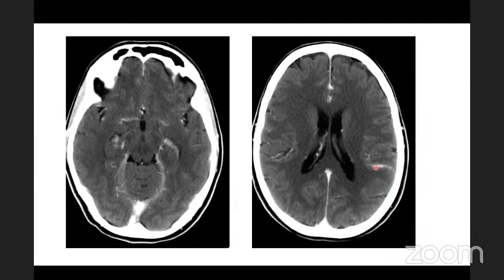But a CT scan, for a trained eye, if you learn not to miss it, you can pick up these patients even before they develop the very florid signs of neurodeficits or vasculitis or strokes, as illustrated in the prior case. The prior case was a very late stage TB meningitis. This is an early stage TB meningitis, which is shown in this picture, right?